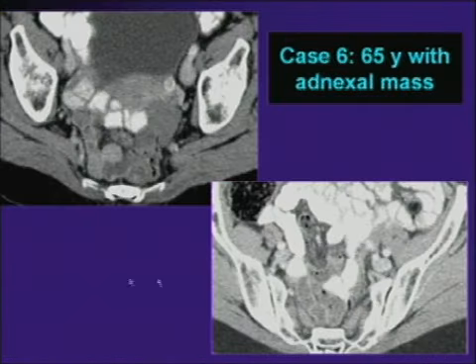The patient came to CT, and that's actually why that went next. And the mass is seen here and appears to be about 50 Hounsfield units. The patient had surgery, and there was a question whether this represents a fibroid or a collection, because what happened was that as we go higher up, we begin to see a small focus here that looks like a normal ovary. And we had the sense that this is actually not ovarian in origin at all, but in fact a mass arising from the uterus or a collection adjacent to the uterus.